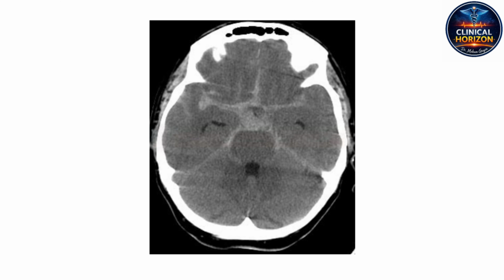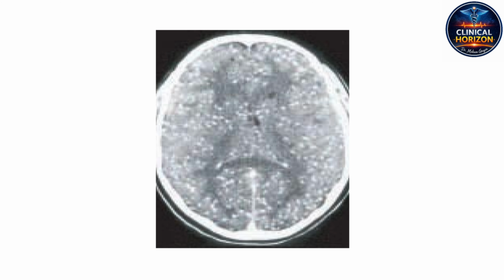Let's transition to a completely different class of pathology for our final two imaging sequences, scans 10 and 11, leaving vascular emergencies and trauma behind entirely. Looking at scan 10, the parenchyma is peppered with dozens of tiny, sharply demarcated, hyperdense punctate lesions. They're everywhere, scattered diffusely throughout both the cortical and subcortical regions of both hemispheres. It legitimately looks like a starry sky. It is a visually striking presentation, but what you are looking at is the radiological footprint of a parasitic invasion.